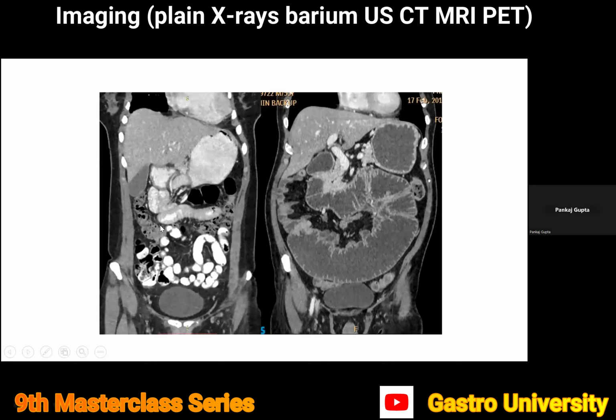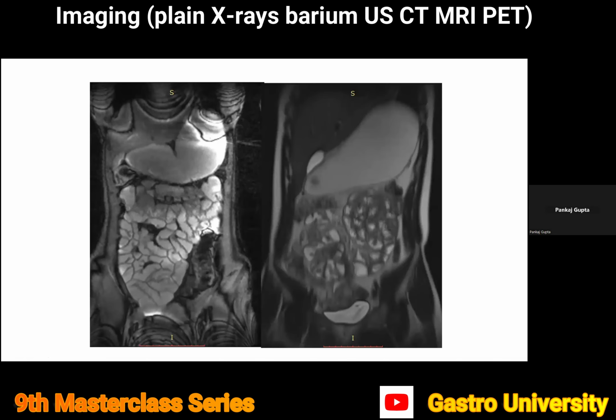So this was a CT of the abdomen done with positive oral contrast. As you can see, there is presence of positive contrast within the bowel. Compare this with this particular type of examination, which is performed with the neutral oral contrast, which is typically a PEG or mannitol. We use PEG in our institution, and other institutions use mannitol, so they can be used interchangeably.